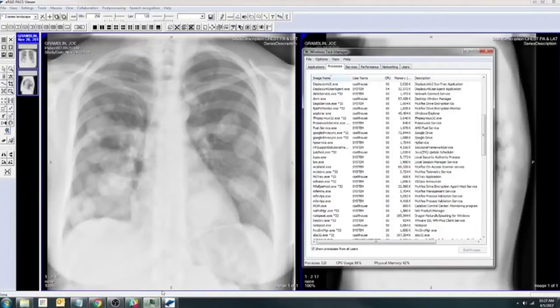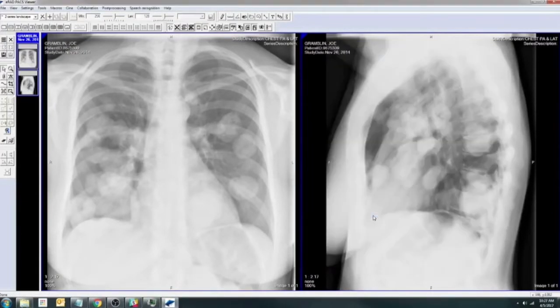This will cause the memory usage displayed next to the natspeak.exe process in the Windows Task Manager to increase to between 200 and 300,000 kilobytes. Depending on the size and complexity of the Dragon profile, this number may increase.